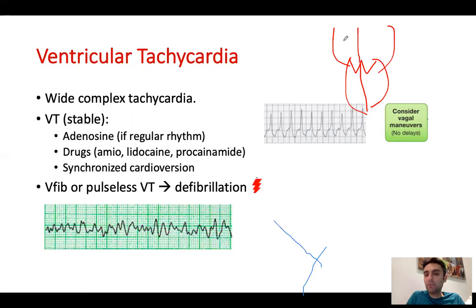Okay. He is in AFib. And this is my drawing for AFib. Usually, if there's no accessory pathway, the AV node transmits a couple of the AFib signals, but the AV node is smart and slows down the heart rate as it doesn't conduct one-to-one. In other words, the patient doesn't go to 300 or 400 beats per minute, because the AV node decrementally blocks many AFib signals. It's protective for the patient.